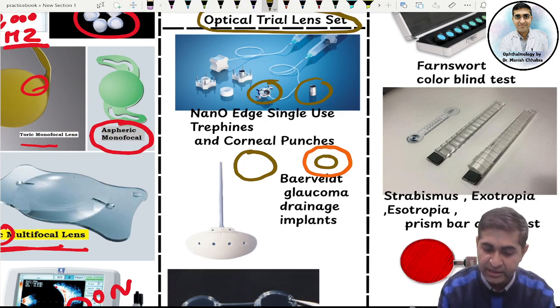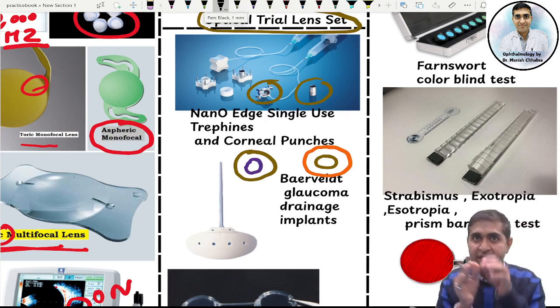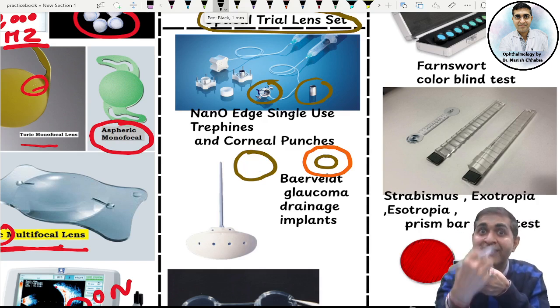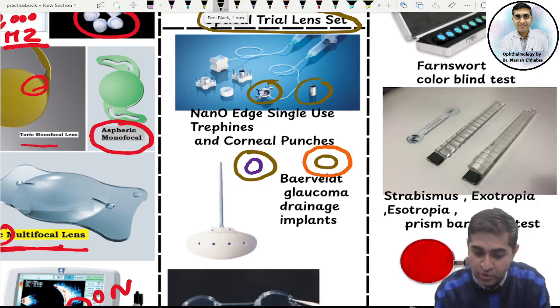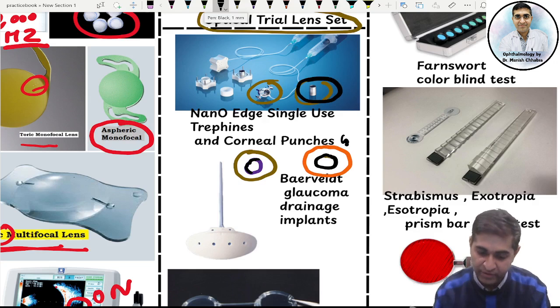and instead you implant, just a moment, it has stopped working. Yes, so there's a hole which is created in the center of the cornea because you have removed the infective or opaque or defective cornea, and this is your graft. So you take the same dimensions and you put it here. For that you need to punch. So this is your trephine. I hope you have understood.